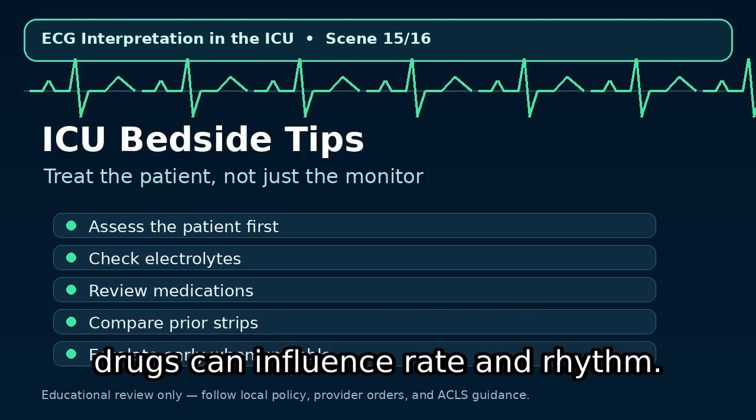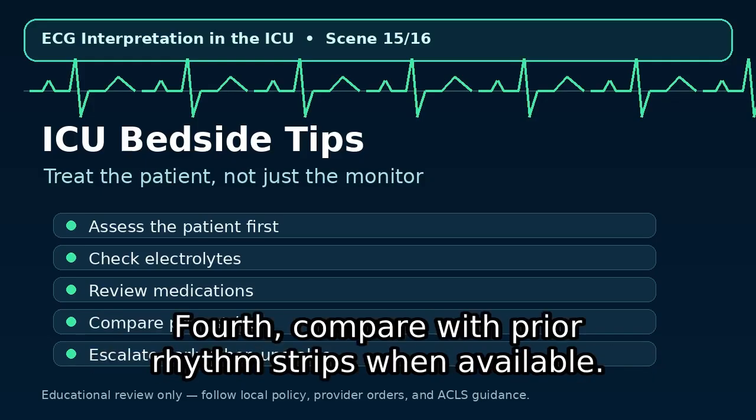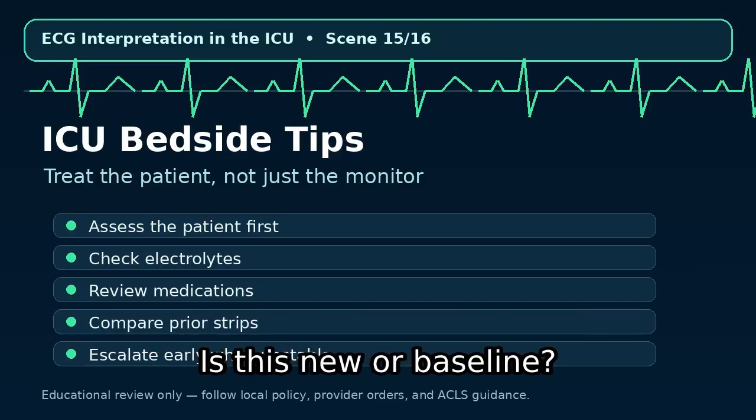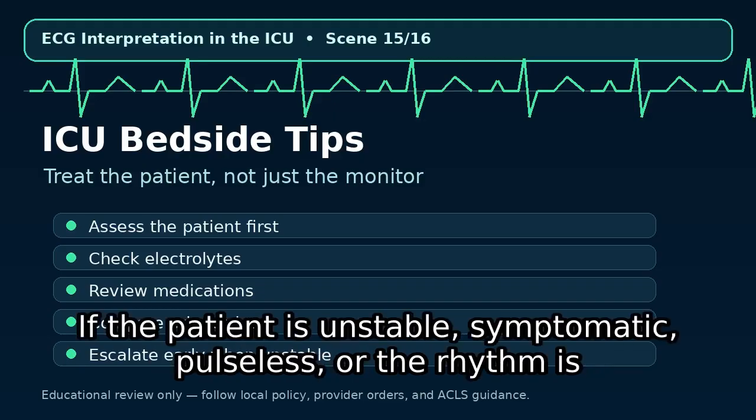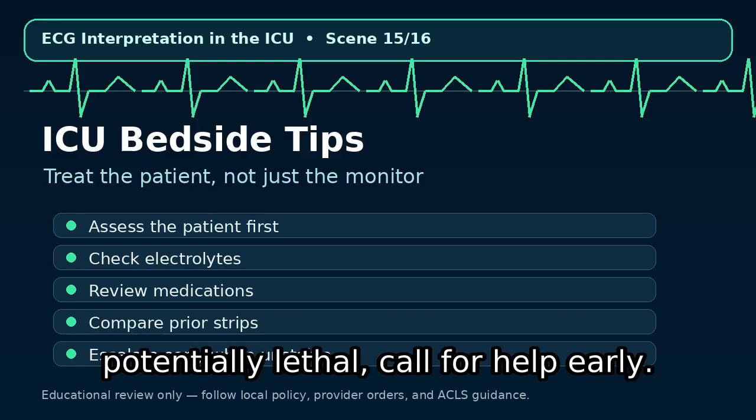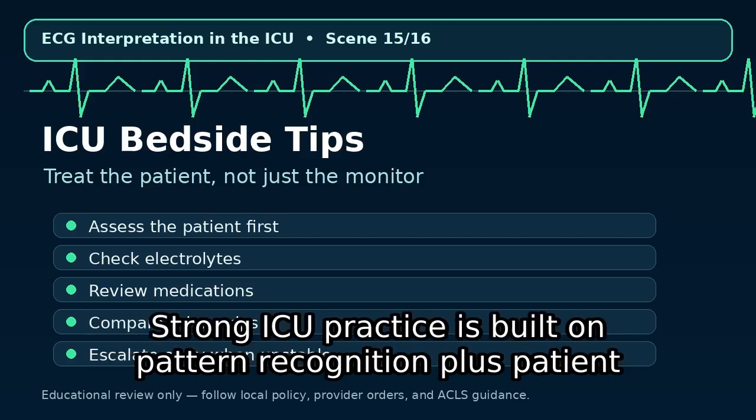Fourth, compare with prior rhythm strips when available. Is this new or baseline? Fifth, know when to escalate. If the patient is unstable, symptomatic, pulseless, or the rhythm is potentially lethal, call for help early. Strong ICU practice is built on pattern recognition plus patient assessment.